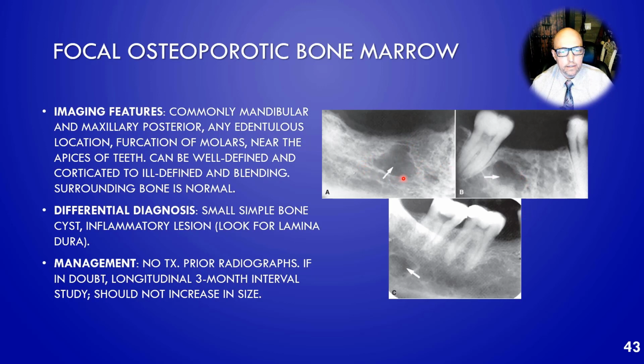So they're typically not perfectly round like a cyst, a little more irregular in shape just because of that, because it's just marrow space, and the surrounding trabecular pattern tends to have somewhat of a jagged or irregular pattern, as we see in these cases.